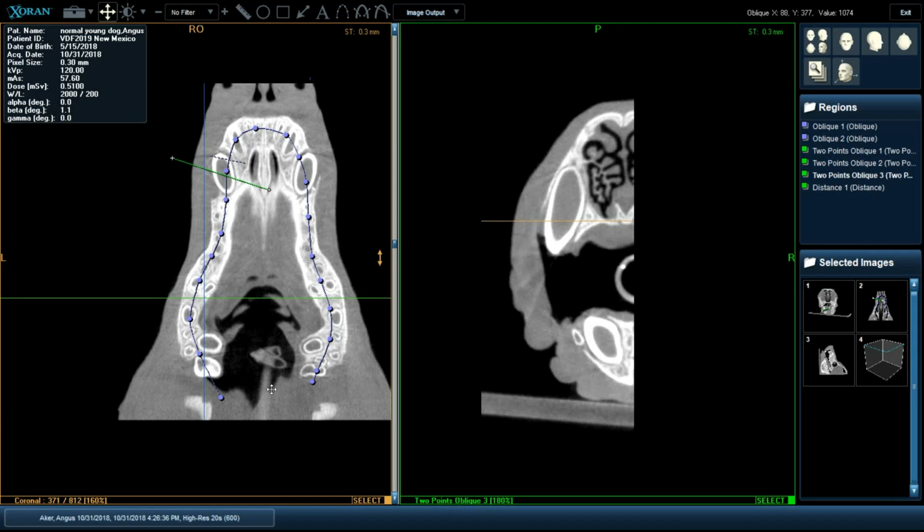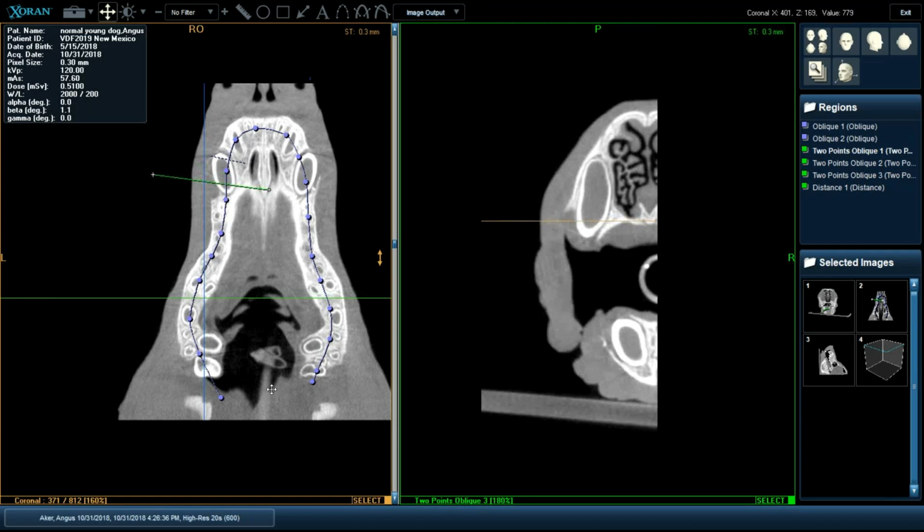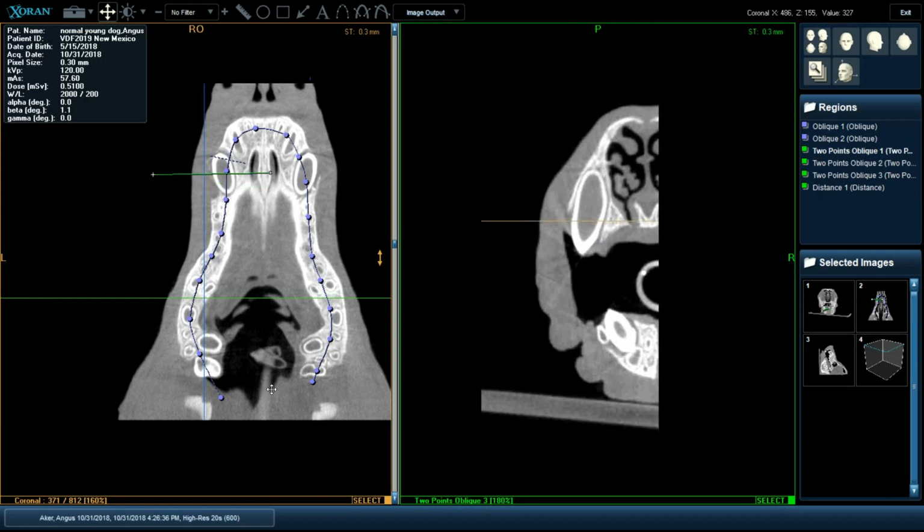We now have a buccal lingual cut of that particular area as a separate image, which we can keep and analyze more carefully. And again, here's the periodontal ligament. This is bone level on the direct buccal. This is buccal. This is lingual. This time we're cutting that tooth virtually by using this line. And if I move this line, I will cut this particular anatomy differently. So I can certainly move this, and you'll see that the right quadrant changes accordingly. And we can go on like this just as much as we want.